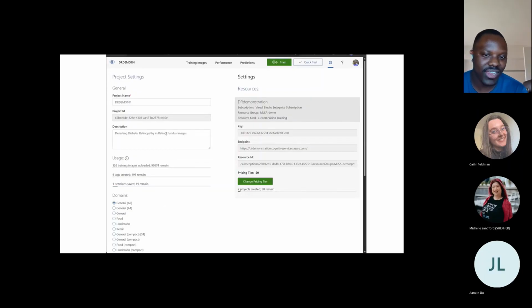That's the custom vision side. Again, these are parameters which we'll need from the Powerapps side, which is the project ID in this case on this page. So we'll need that later. So we've seen how to build custom vision to upload files, to label them, and to create models and to evaluate them.